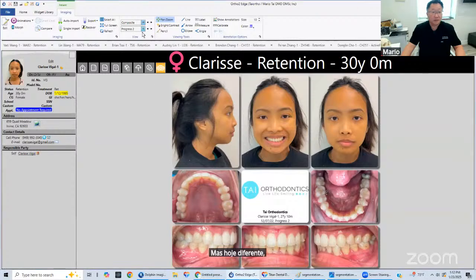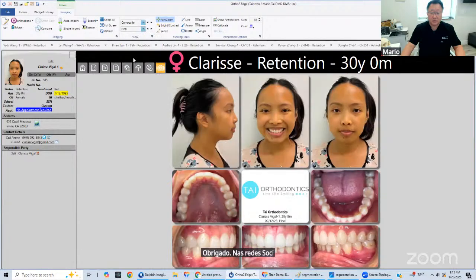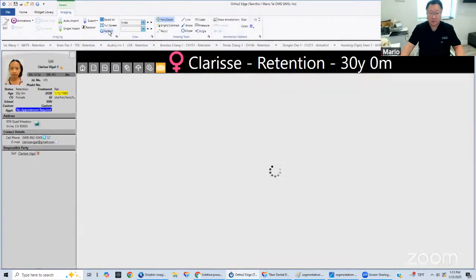And let's just go back here. Look at her final again. Her final? No. Yeah. Oh. Right. Progress. So slow. Looking it up. Oh, I think it was.